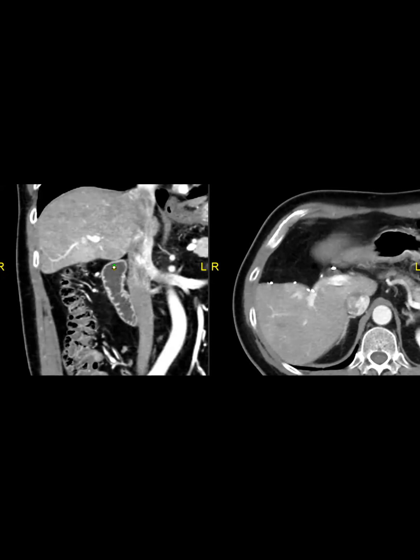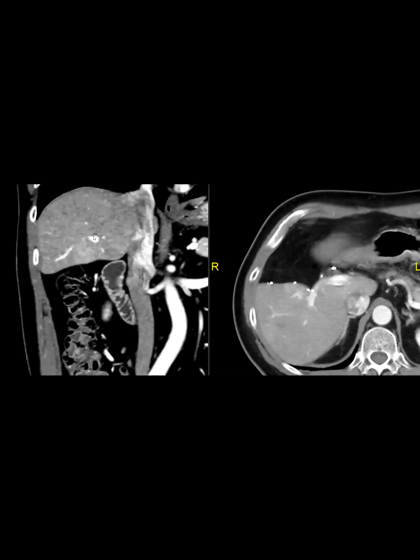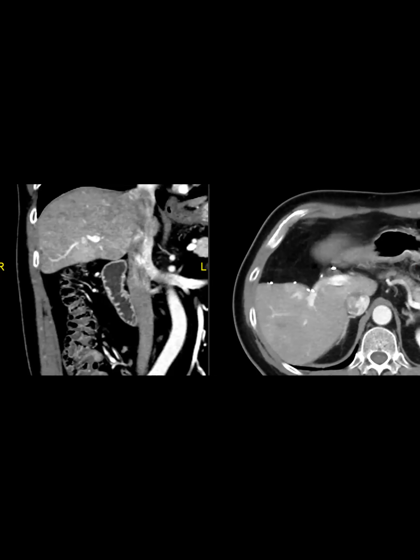If you see something really big, just really look carefully at the apex of the perfusional changes, this new perfusional stuff, to make sure there's nothing there. And there it is. And yeah, so that was cute. This is a nice companion to the one you showed last week with the pancreatic adenomas that were making perfusion abnormalities.